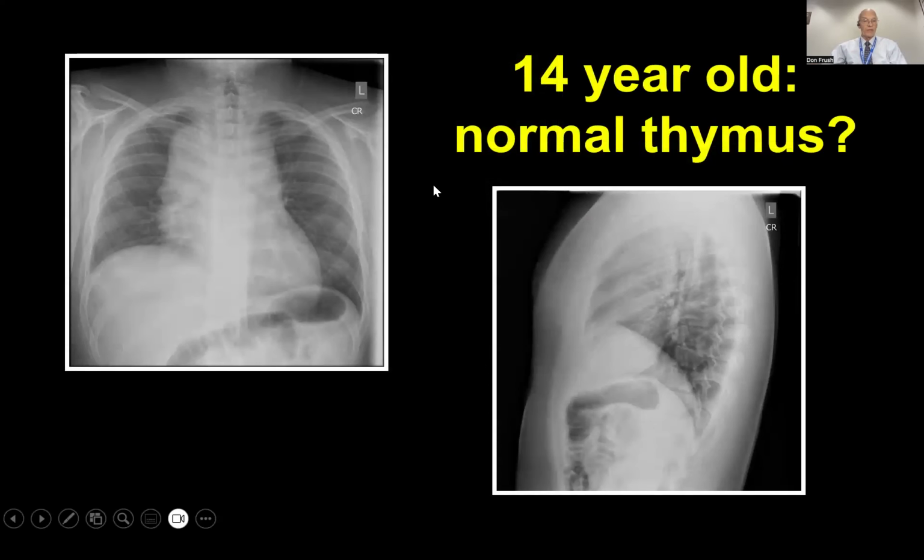So now we have a 14-year-old here, and you can see there's some elevation of the right hemidiaphragm, right? We're looking at all our structures.